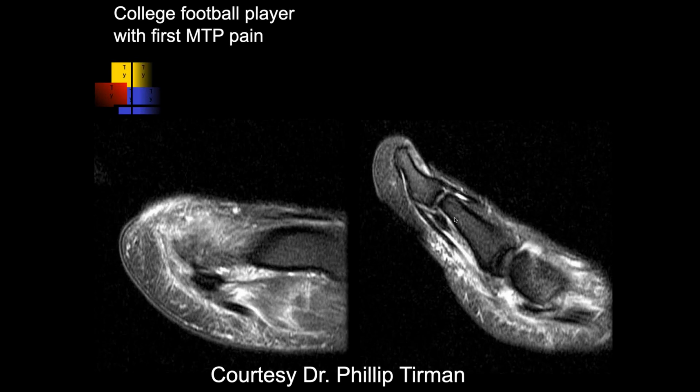So here we've got the sesamoid phalangeal ligament torn over here, the intersesamoid ligament as well, and primarily involving that medial sesamoid. Here's a college football player who had pain on the first metatarsophalangeal joint. What we can see here are muscle tears or strains which are producing the pain. I believe this is medial, and this is going into the medial sesamoid bone in that location. And here we're going a little bit more toward the midline. We can see there's also a tear of the sesamoid phalangeal ligament as well on that side.